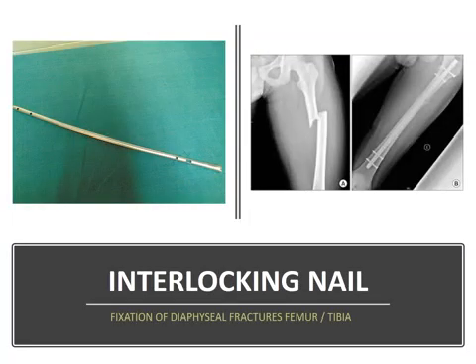For that, later on, we have devised interlock nails. Interlock nails are the nails which go inside the bone and then subsequently are locked with the screws to the bone to provide a stable fixation, more importantly, rotational stability.